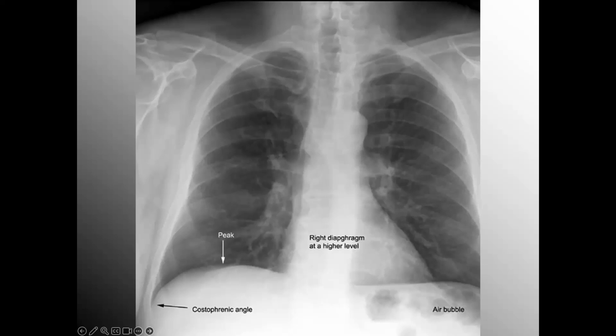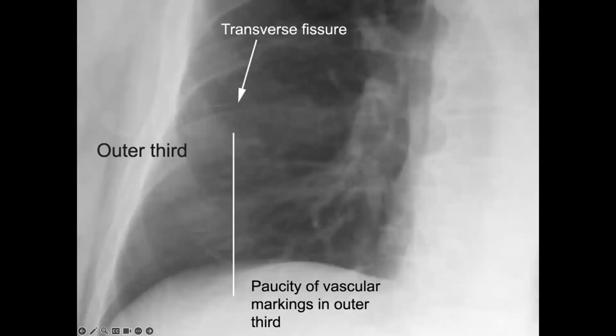This does not mean it's air trapped in the lung tissue. It is air in the stomach itself, also known as flatulence in the making, or maybe a belch. This transverse fissure labeled here is rather discrete, which is why it's called out.